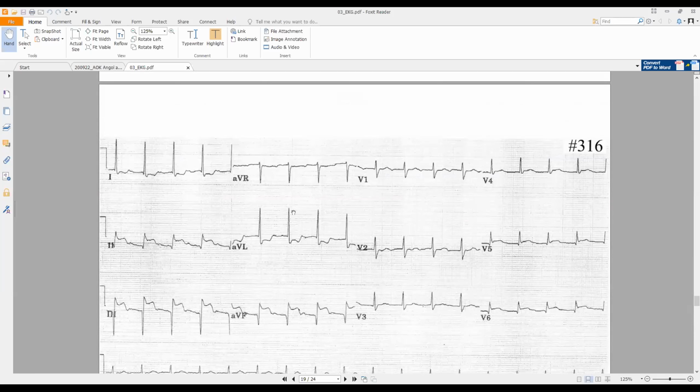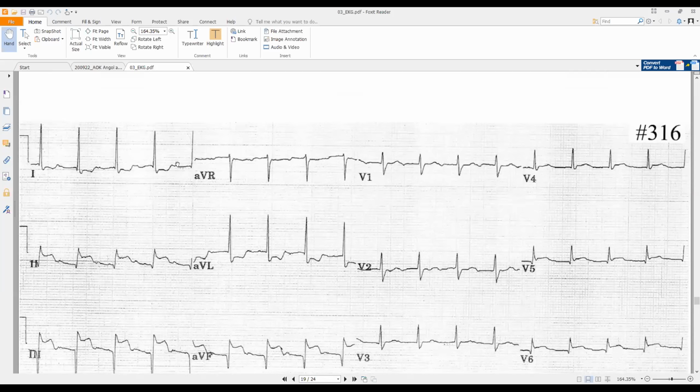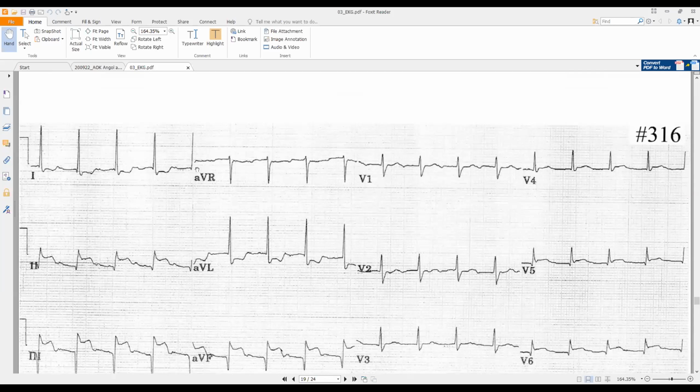Right. So now P wave. P waves confuse me. There is a P wave, and we also see that the PR distance is greater, but it is rhythmic and we have no skipped beat. So we are talking about a first degree block.